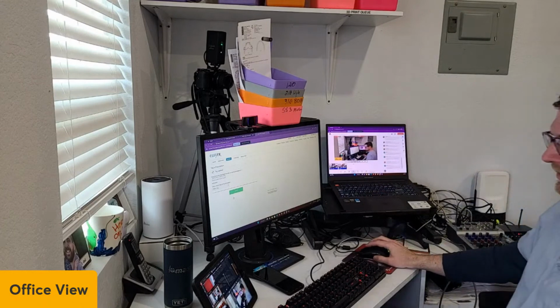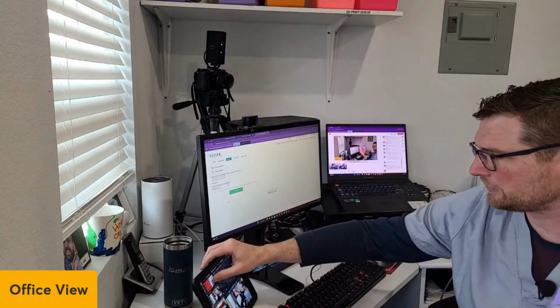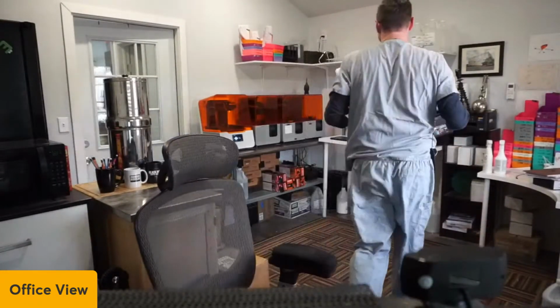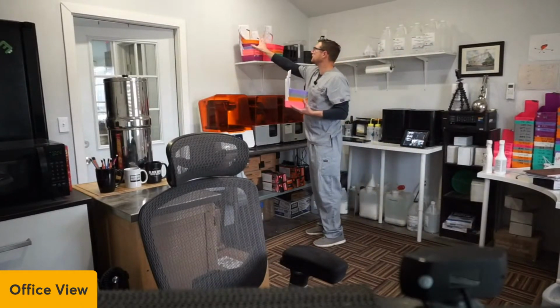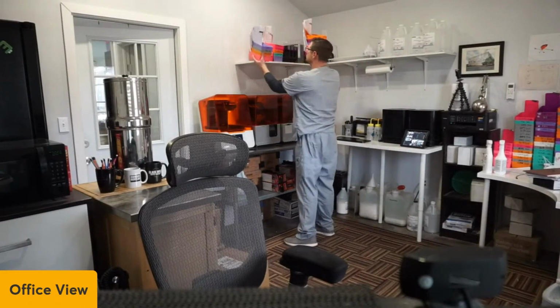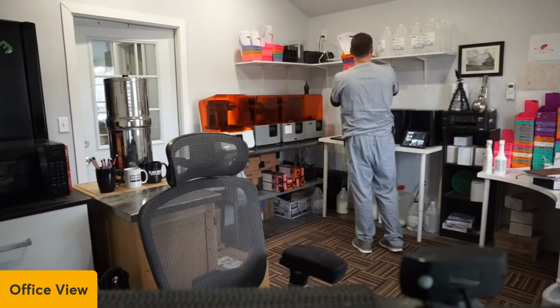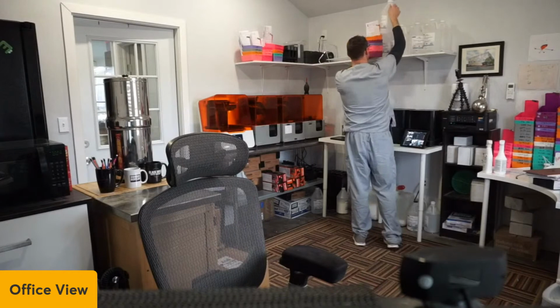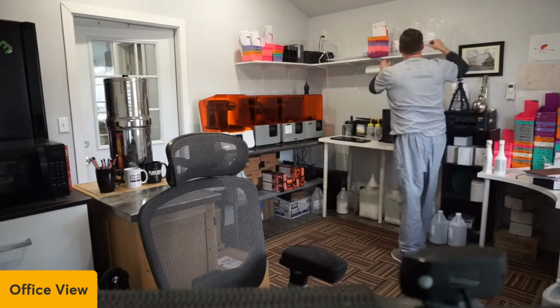So let me change my camera angles here. All right. So then I come over here and I put it up here. As you put these over here, I was doing some moving stuff around.